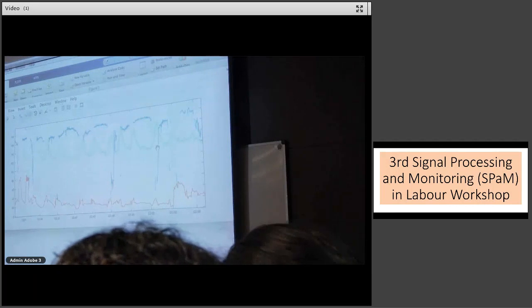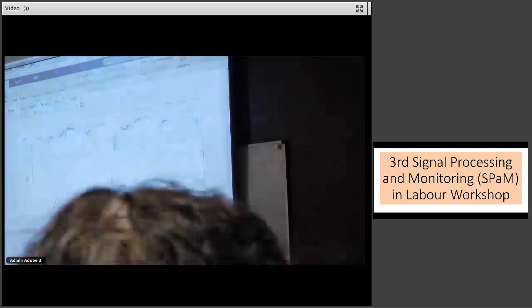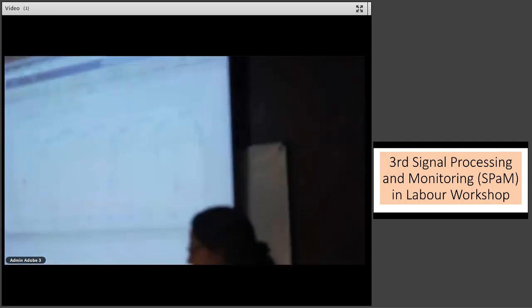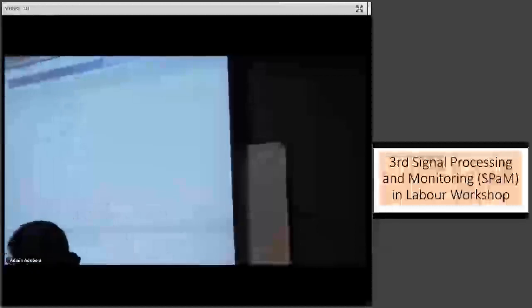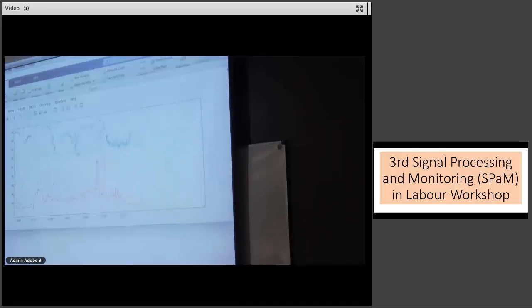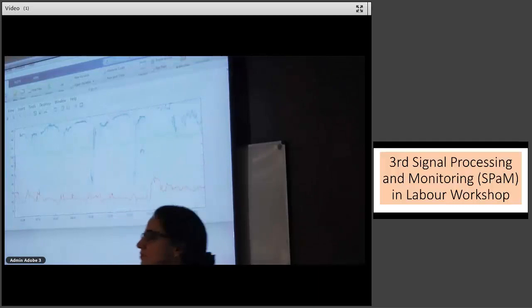But I think in the segment where we were debating the stability of the baseline, there was coincidence of maternal and fetal heart rate in that sequence. What went on there is pretty difficult to be certain of. But if I may just return briefly to stable baseline or no stable baseline, I think once you have accelerations and or decelerations, by definition, it's impossible to maintain the case for a stable baseline.